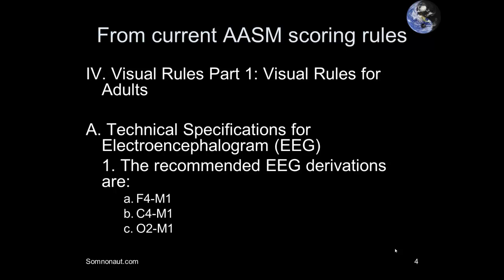Qualified slow wave activity for the purposes of N3 determination should only be determined from the right frontal derivation, or if that's not available, then the left frontal. If that's not available, right central, and so on. The point being, slow wave activity is to be accrued from only one channel, and it should be the right frontal. Moving along, I'll be presenting a string of 30-second epochs from a recording that showed some very pivotal epochs of N3 slow wave activity for N3 determination.